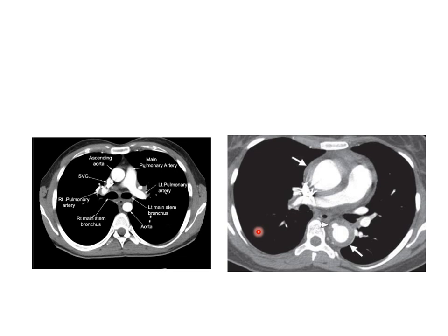As we said, the normal is regular, thin wall, and here we can see that the Takayasu affects both ascending and descending aorta to cause thickening of the wall, concentric thickening, and cause ulceration of the descending aorta.